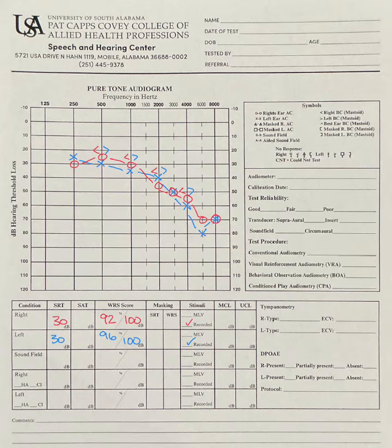For my pediatric patients, when I'm explaining results to parents, I typically keep the results very short, sweet, concise for them. But for our adult patients, I like to add a little bit more detail so that they have all the information that they need and can really be educated and informed to make the best decision moving forward. So if I have a patient with this kind of loss here, this is how I would explain it.